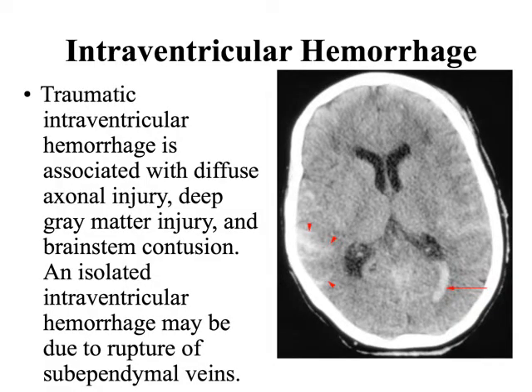So intraventricular hemorrhage. So again, associated with trauma like a car accident, and we see one here in the lateral horn. And then also over here, related. So this could be the kind of thing where there's a side impact injury, and the patient was hit from the side. The brain kind of sloshed around, and we now have bleeding within the ventricles as well as on perhaps the side of impact.